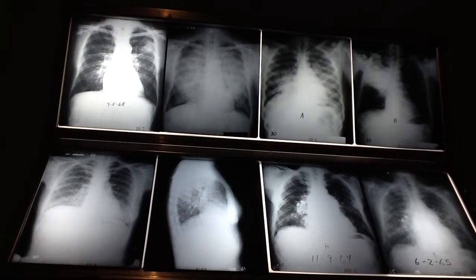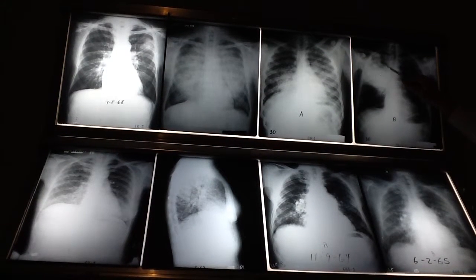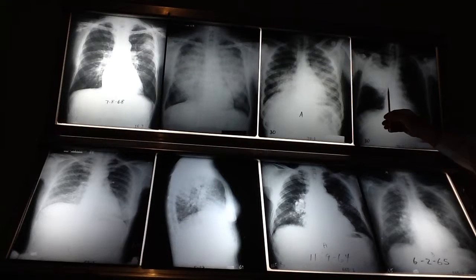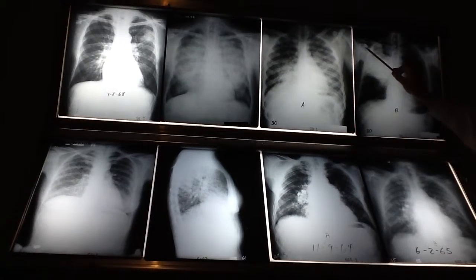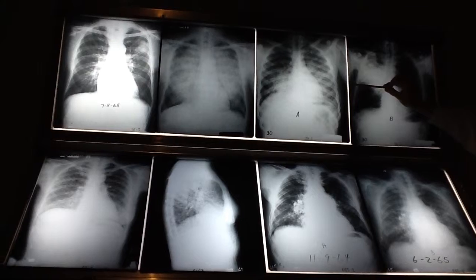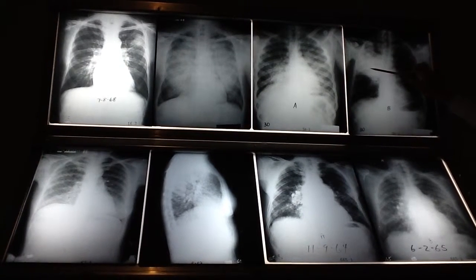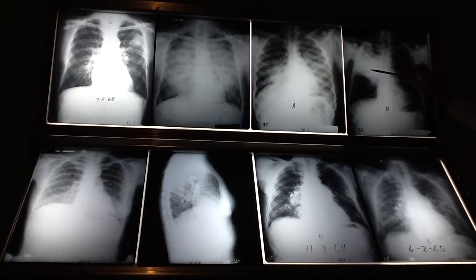You see? Because this is very dense. Unilateral localized density. Silhouettes the chest wall, silhouettes the ascending aorta at the mediastinum, and what's this? Minor fissure. Okay? We looked at one over there that had significant displacement on the minor fissure. The thing was sitting up here like this, right? Did the minor fissure move? No. So this cannot be atelectasis, exactly. You can have that density with atelectasis, but not with a minor fissure in its normal place. It just can't work like that.